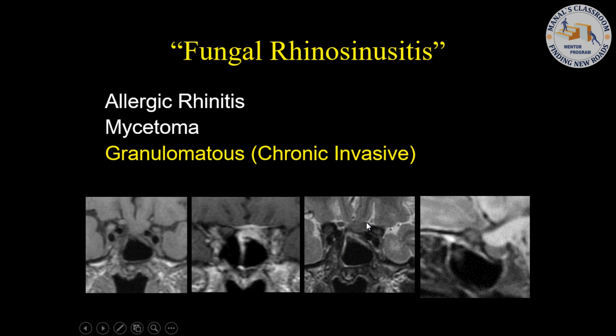And so when you perform T2 weighted imaging, in this case what we see is a mass here that is low T2 signal. In fact, you can look at this right here, and that's probably a part of the optic nerve here on the right-hand side, and there is the mass here. And then on the sagittal images, a sagittal T2, notice how there's low signal as well too. So this was biopsied, and this came back to be quote-unquote an Aspergilloma.